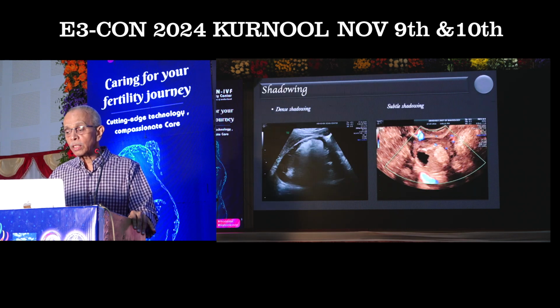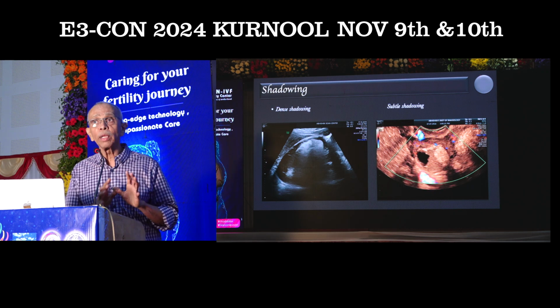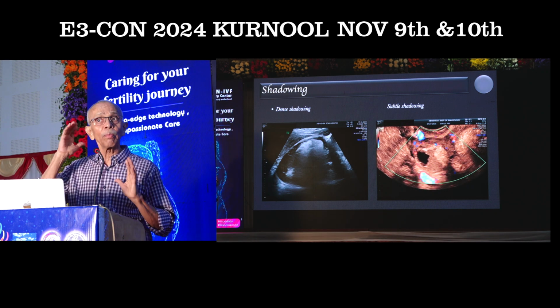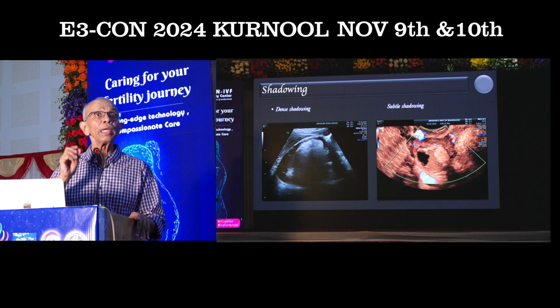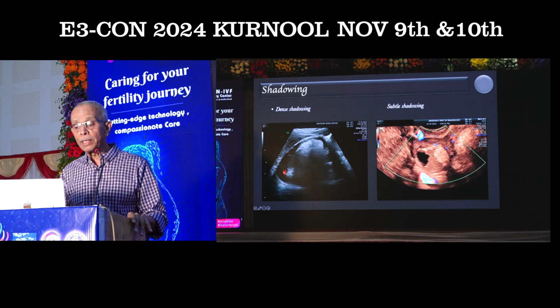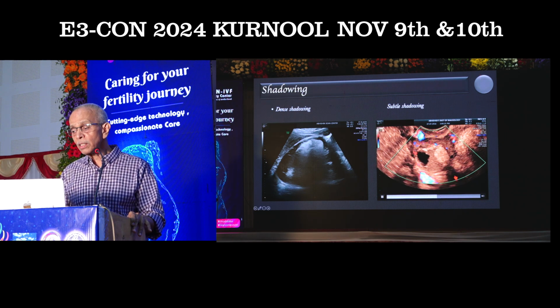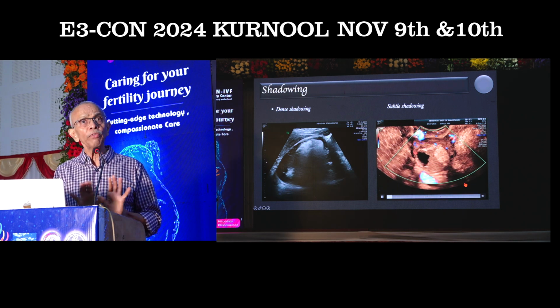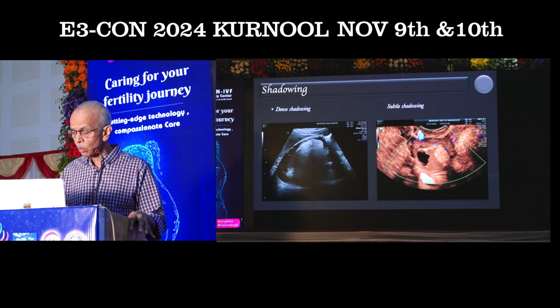Right. Then comes the shadowing. Shadowing is extremely important, because we all know that whenever we have an adnexal lesion which has a calcific area, quite often our mind will think in terms of a benign lesion. That is the reason why shadowing and calcification are extremely important here. This calcification can be a dense calcification, as you can see here, or it can be a very subtle shadowing that you can see here. So these are the two different types of shadowing that you may come across in your practice. This is one thing which we have to identify.